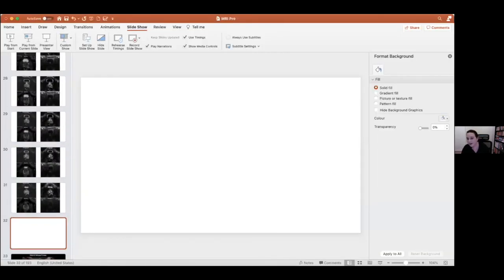The tumor perfectly matched the PSMA PET MRI. On histopath, yeah. And I even made them go back and have a look and look for mucin, look for cribriform, look for everything because I couldn't understand why I couldn't see it on MRI, and they couldn't answer it.